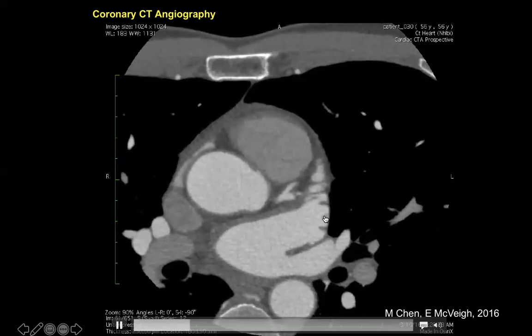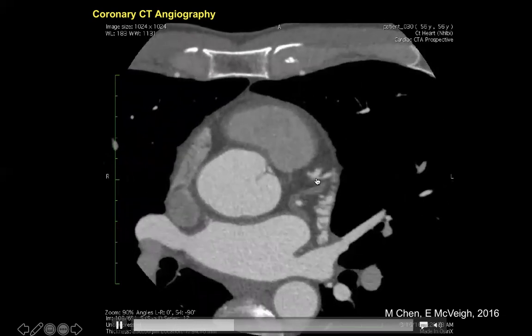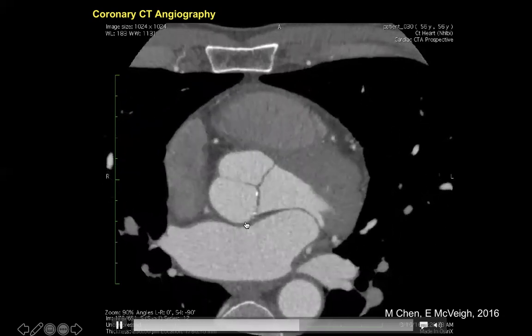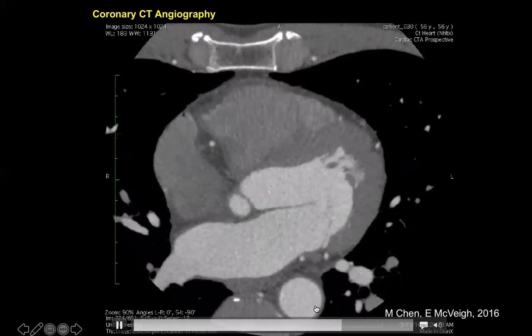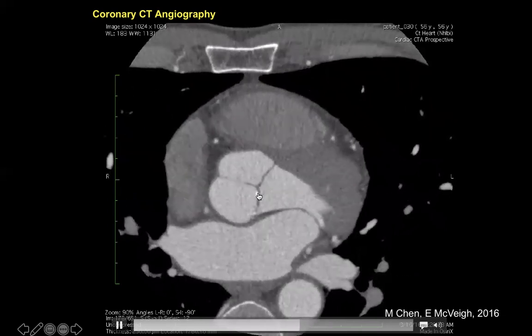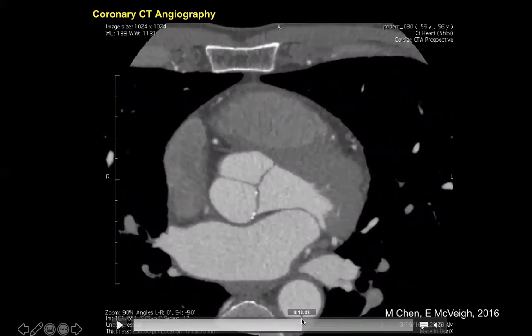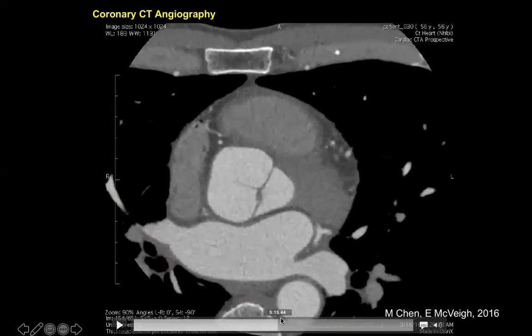And you can see the very high resolution details in the left atrial appendage, I should say. You can see the actual details of the wall of the left atrium, really good resolution of the valve leaflets, and a very small piece of calcium on that valve leaflet, indicating this person should watch out in the future because they might develop a larger chunk of calcium and get some kind of aortic stenosis. So, something to keep an eye on.